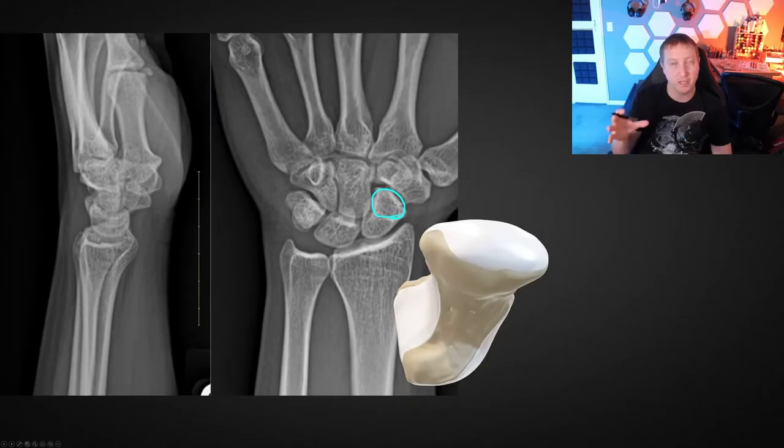And so the more ring-like it looks, of course, the more down the shaft of it you're looking, if you will. That can actually be concerning in some cases if it's abnormally tilted. But in this case, it looks normal, and we can always correlate that on the lateral. And then look at the angle between the scaphoid and the lunate.